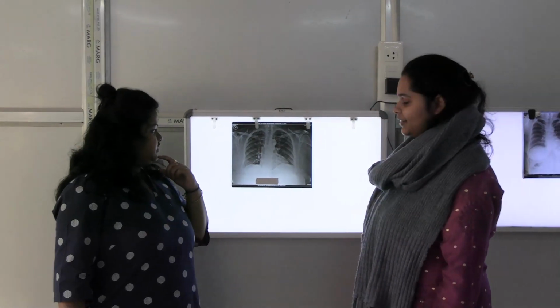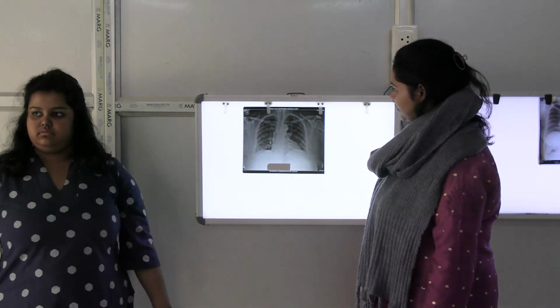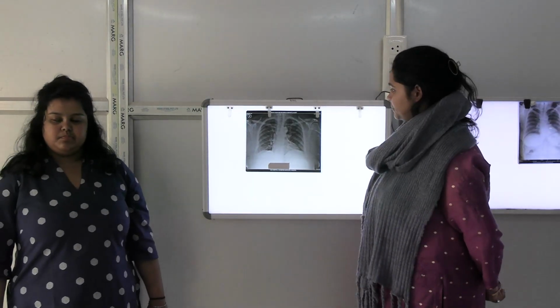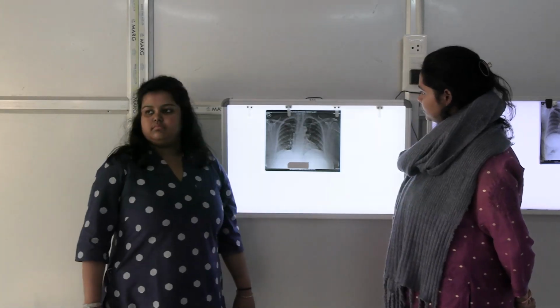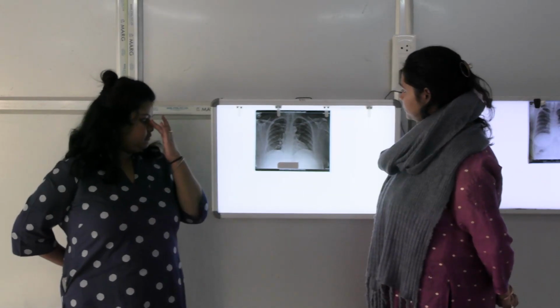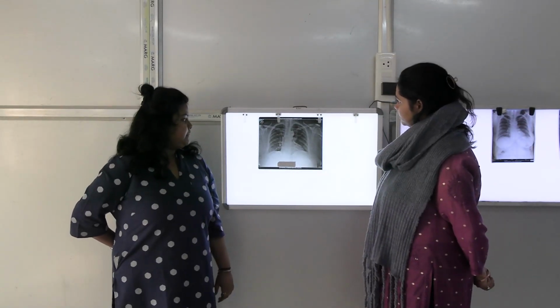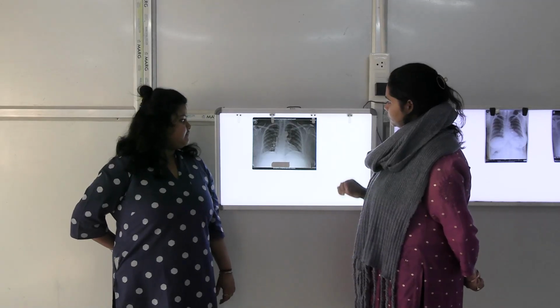What is the mediastinal space? You have to define the space, right? So you have to have a boundary, right? It can't be that you show the mediastinal space as something expanding or like that. So you have to define the space. Every space has points, like from here to here, above, below, right to left. So you have to figure out the space which is present. So how are you going to identify that this space is the mediastinal space?